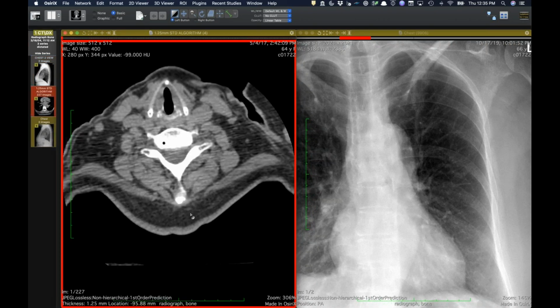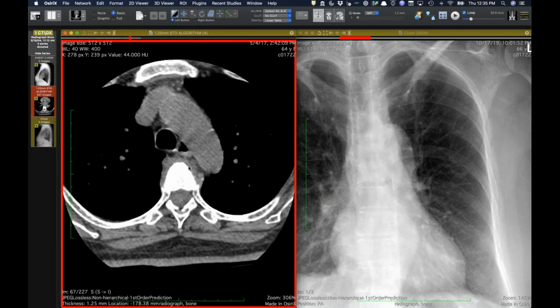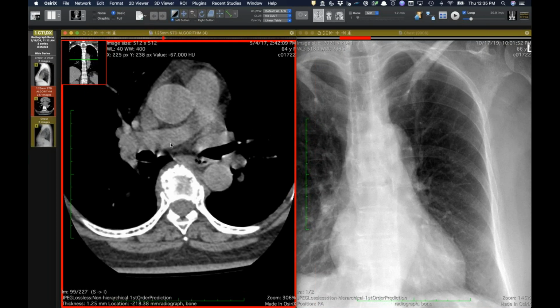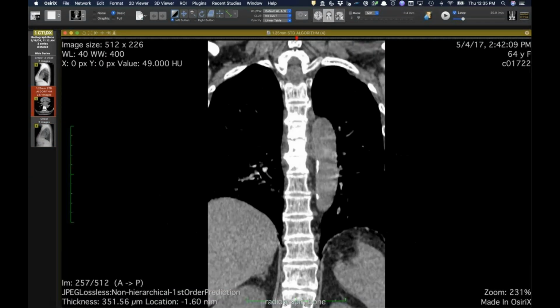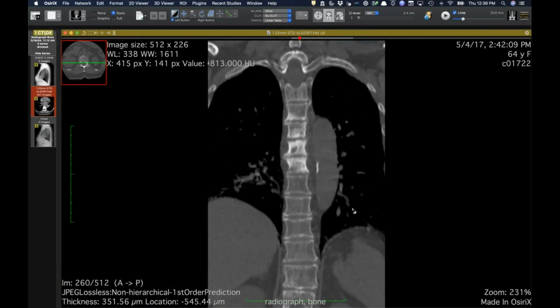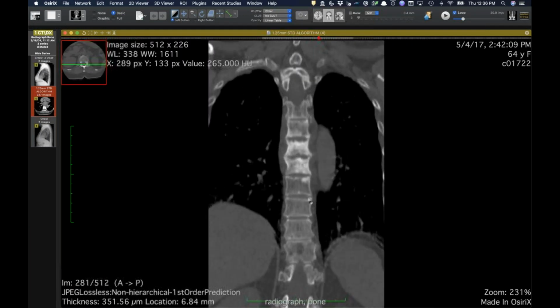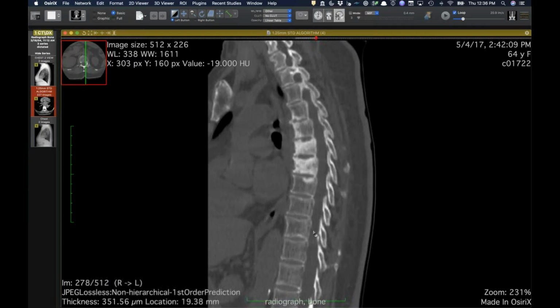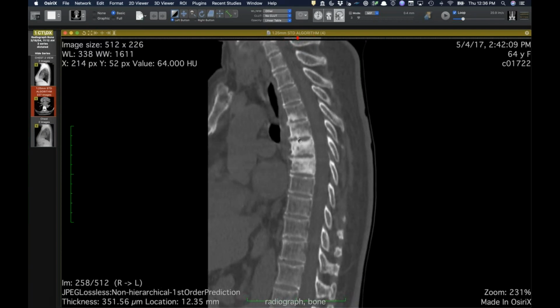But this lady's had multiple spinal CTs and MRs over the years. This is one from 2017, and you can see a little bit of soft tissue surrounding there. And her history, I'll show you a sagittal on this. This is extramedullary. No, it's not. She doesn't have that history. The only history she has is psoriatic arthritis. Oh, really? And she's had an extensive workup for infection, always been negative. And so this is presumptive, just seronegative spondyloarthropathy related to psoriatic arthritis.